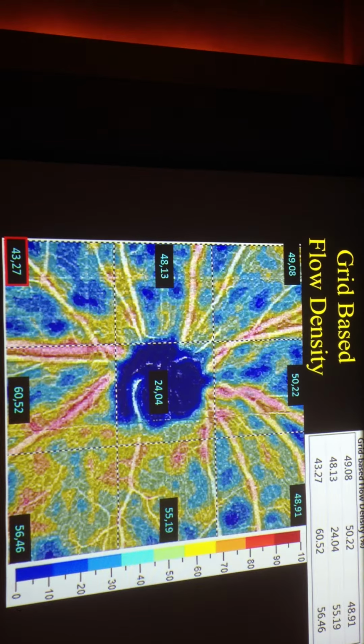And so in this stage of the software, we are able to analyze the objective alteration of the vascularization. But this takes into account that we have practiced the acquisition at the right position, we have selected the good segmentation, and so you will have confidence in the results if every point of this acquisition and analysis is okay.